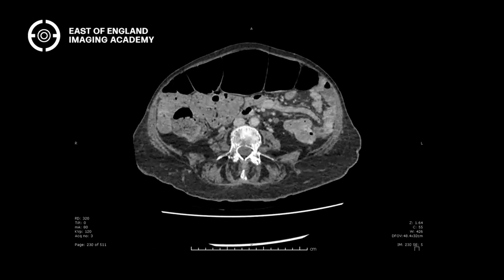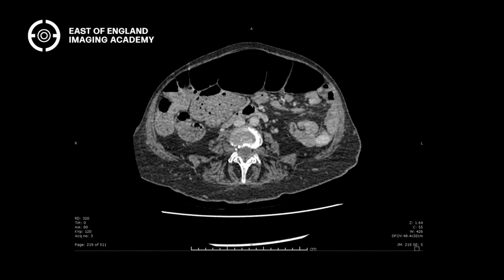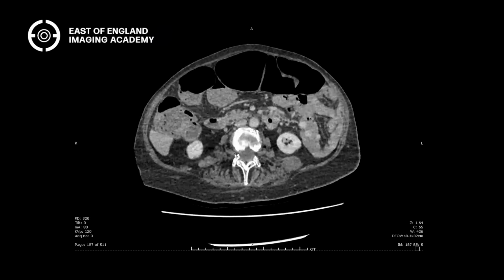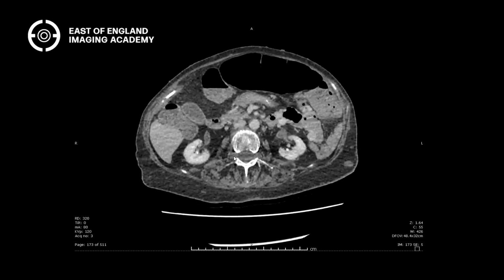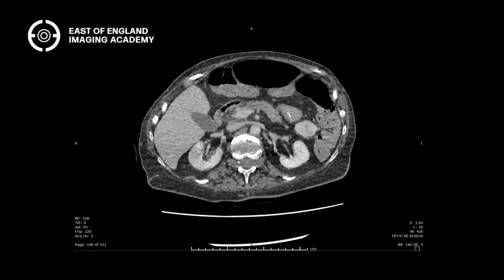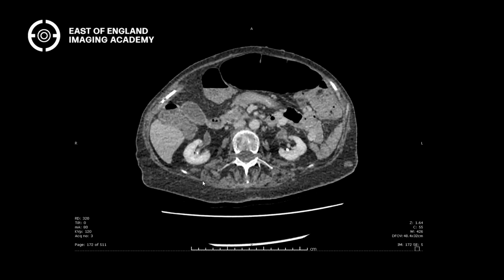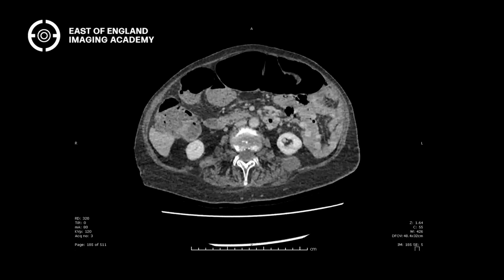And then you're looking at the paravertebral regions. Now, normally in the paravertebral regions here, you only see fat. But here, at pretty much every single level, you've got some funny soft tissue at the paravertebral regions, just coming out of the spine here. See that? On both sides, you've got this abnormal soft tissue here. You've also got multiple other sort of nodules in the patient's back.